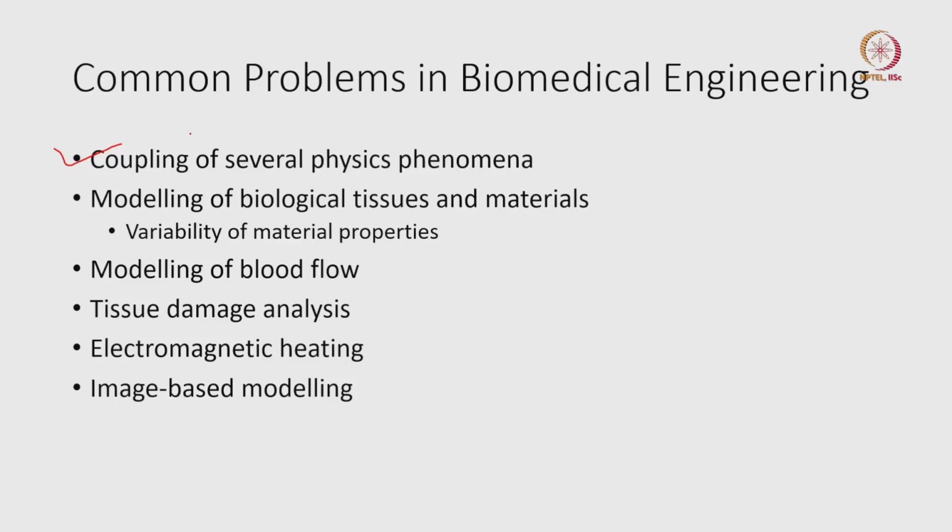So we can see how much we are going to affect the tissues before we actually implement it in an animal model, the prototype in an animal model or human trials.